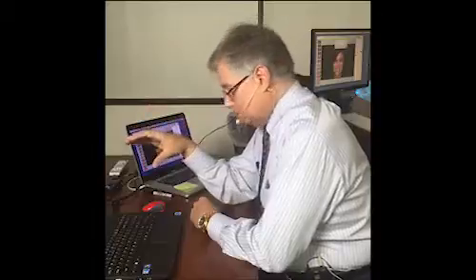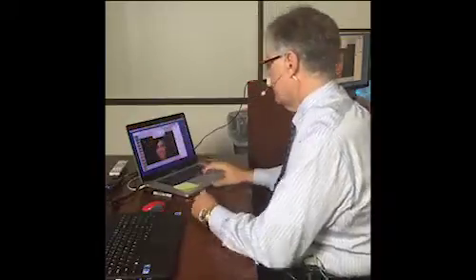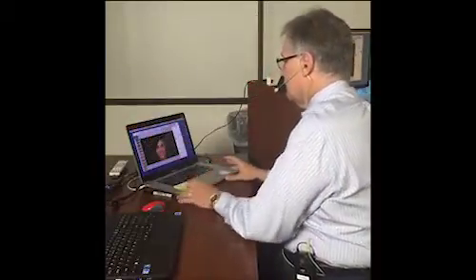The reason for that, again, is that it takes up tons of space. And so I find it easier not to have it on my regular computer because I have lots of other stuff on there. But you may have plenty of room to have them. And if you have a system in the practice, what you're going to want to have is probably a place where you set aside a partition or an area on the hard drive where you're backing up all of that imaging. Okay? Good? So I'll save it.